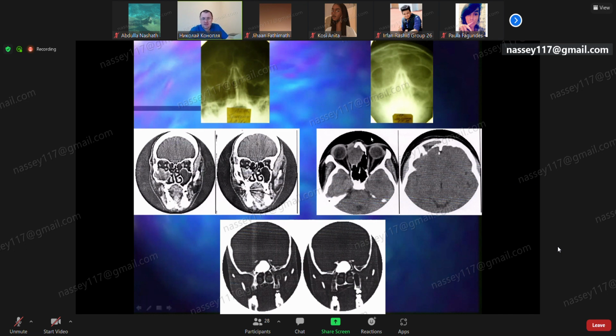Another patient. This is CT in the horizontal view. Here you can see the orbits, and here you can see a tumor. It affects what is between the orbits, the ethmoidal cells, the nasal cavity, and even spreads onto the face under the skin. At another level we can also see it affects the frontal sinus. Well, this is a malignant tumor. It has such a big size and affects so many parts: paranasal sinuses, orbits, nasal cavity.